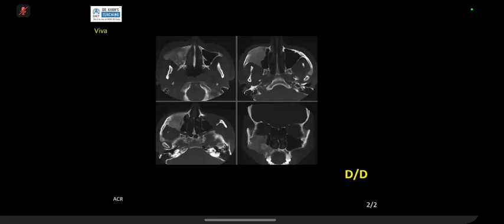Okay. The other possibility is, if there was no abscess, it would be in keeping with bony proliferation. So the appearance is ground glass and heterogeneous. In a young patient, for example, we think of fibrous dysplasia as the top differential. Which bone is involved?